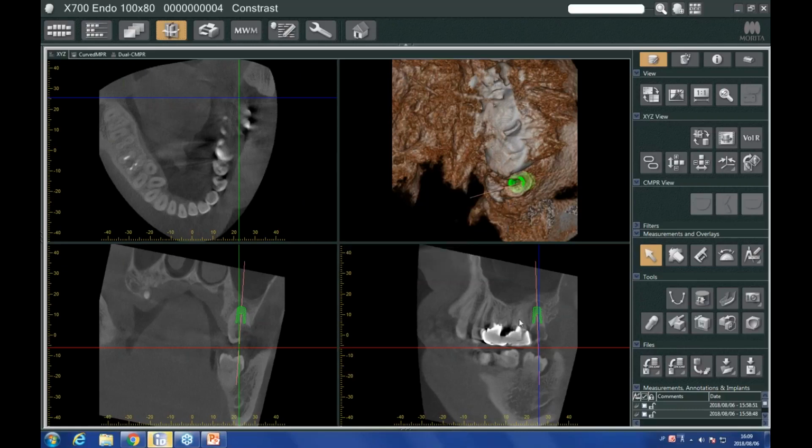Again, the name is for me and my benefit only. You can name it whatever you'd like, or you can leave the name as default. It doesn't matter. This data is not duplicating the volume in any way. This is just saving a snapshot of what you're looking at here. So feel free to save as many times as you need for this particular patient study.